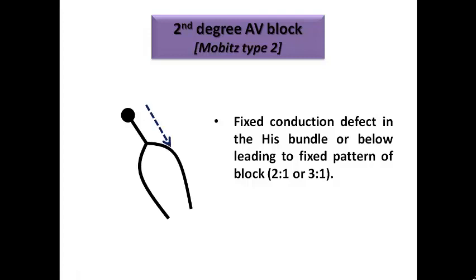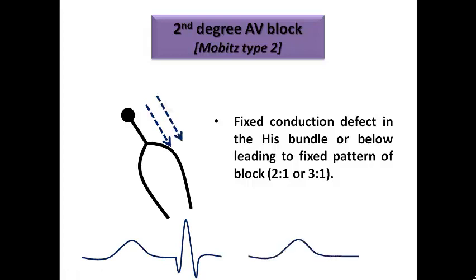So let's explain much more. For example, one beat can pass through the ventricles without a problem. It may pass normally or may pass slower. But for example, the second beat is not conducted, and so after I have a P and a complex, I can have, for example, a P without a complex following it. So it is different from first degree AV block, which was just a fixed delay in the AV node, but each P wave is followed by a complex.